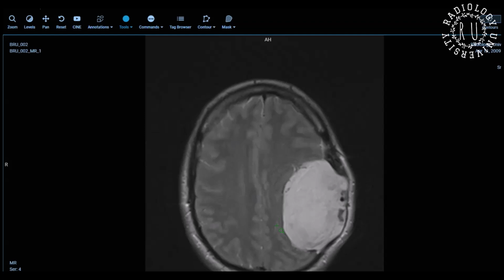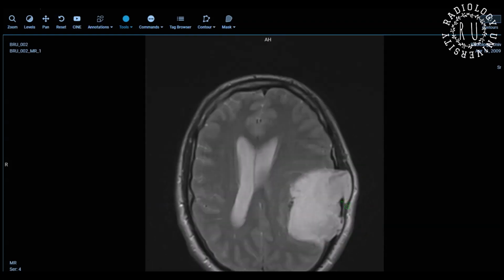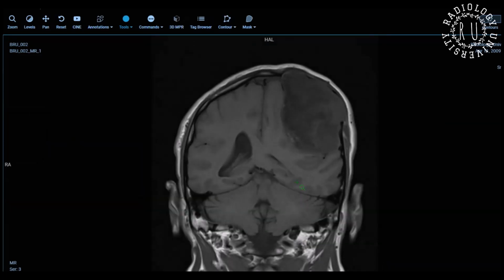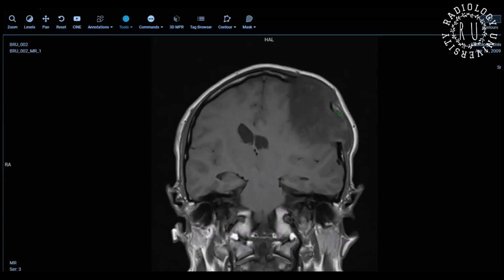So how many meningiomas and Langerhans cell histiocytosis, which are hyper? Usually they are hypo. Unless the very rare meningiomas, which are microcystic meningiomas, they will be hyper. Hemangiopericytoma, I agree, would be hyper, but it will have a lot of flow voids inside, because it's very, very vascular. So you picked up these things right, that these are hypointense, but that's why I was giving you T1 images.